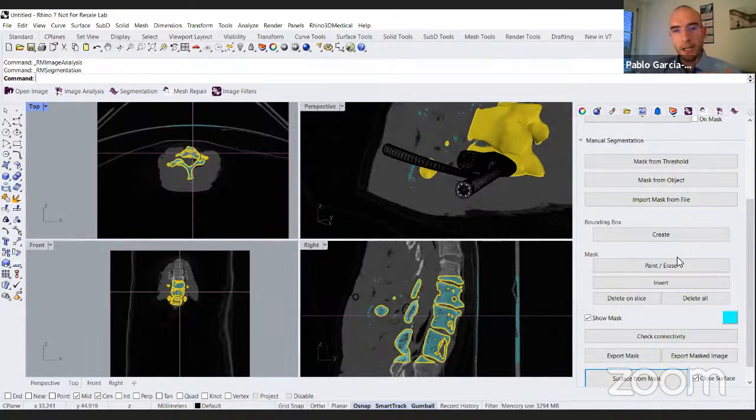In segmentation, I went a bit deeper, converting that into a mask, running a bounding box over it, and I can still go further and remove details with manual painting tools. And I could also import or export masks at that stage. And that was for segmentation.